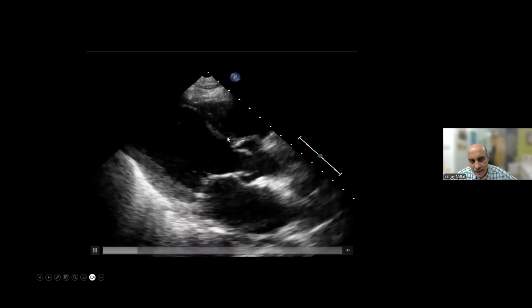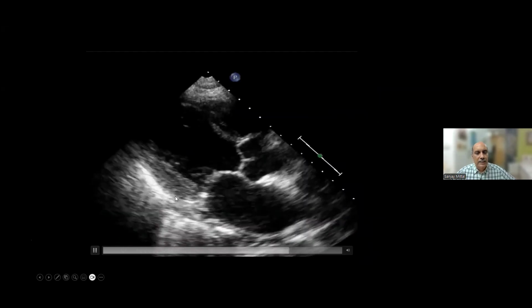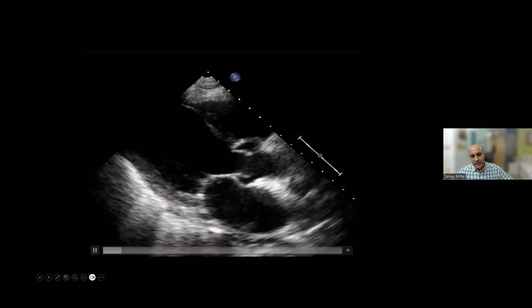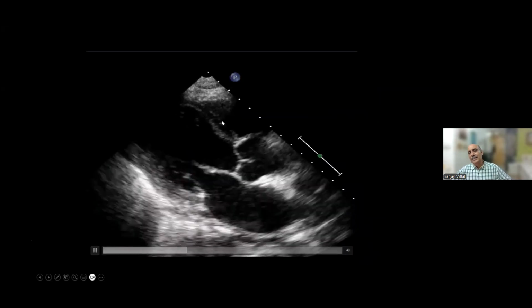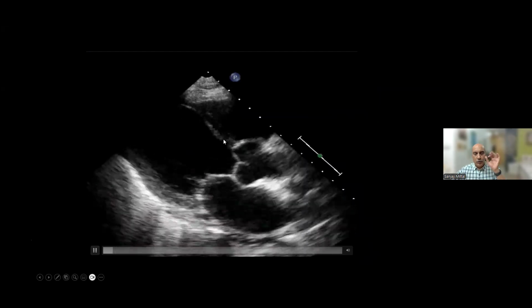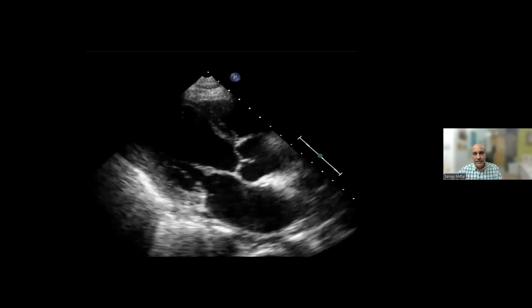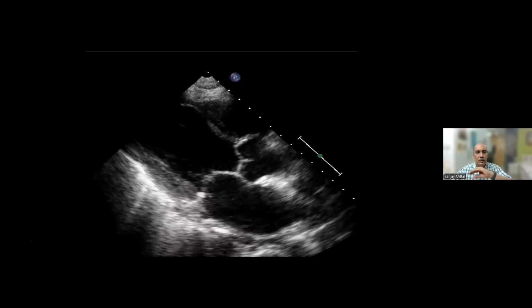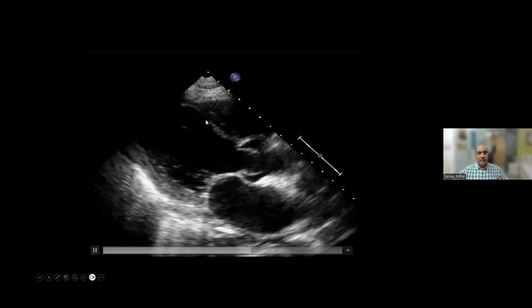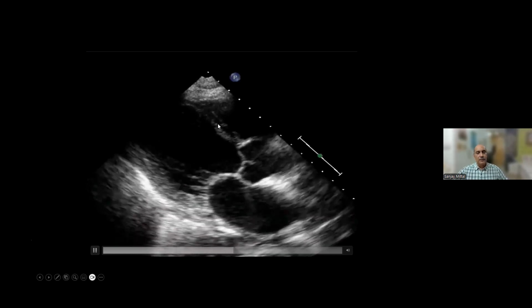But on the other hand, if you look at the anterior septum, this is not contracting as well as the posterior segment is. So this is less. And mind it, if we go back to our description of contractility, the contraction here is less than normal. And that is why this is hypokinesia, because our eyes do not perceive the movement or thickening of less than 20%. That is why in akinesia, for a naked eye, it would seem as no thickening at all. And that is why it is called akinesia. It's very difficult to measure the exact thickness changes, but if it is perceptible thickening, then it is hypokinesia. If there is no thickening perceptible, we call this akinesia.